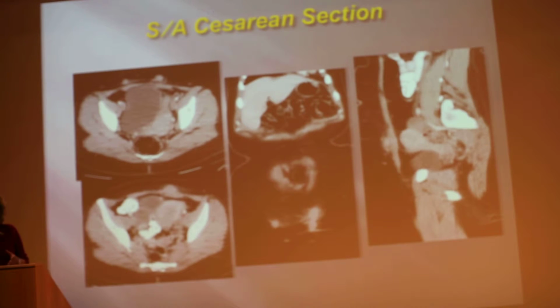Endometrioma may be implanted in the location of a former C-section scar, and it's very common to see these masses at the abdominal wall, and these masses may be painful every menstruation.